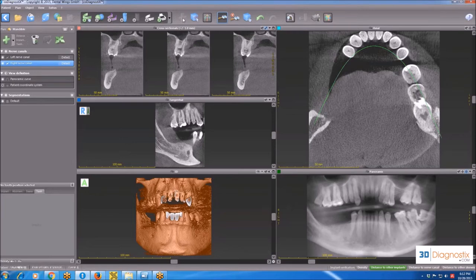First one we have here is an implant with 2 green arrows. Because I don't have any implants now, it's not highlighted, but later on we will explain the significance of this icon. The next symbol over here is a localizer, which shows specific parts of the scan.